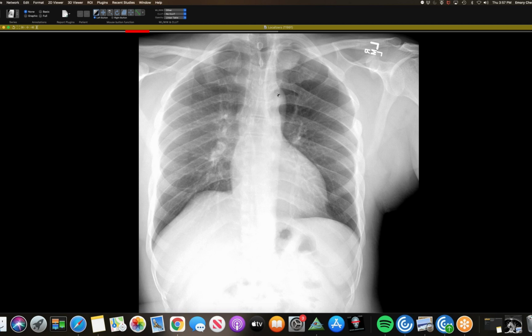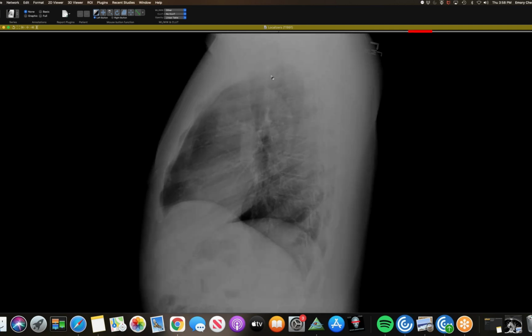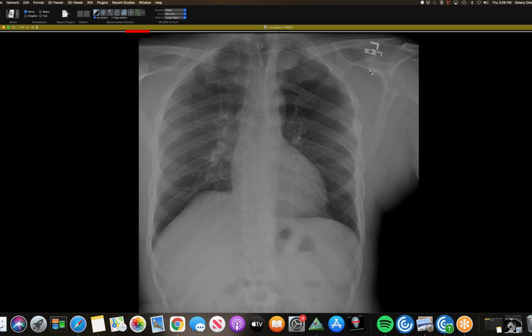I was wondering if you could see the wide neuroforamen on the lateral. I'm guessing it's obscured. I don't remember. Maybe you can make out something here, but I thought it was just a really subtle thing right over the clavicle here. But this person doesn't have other manifestations of neurofibromatosis. This is just an isolated neural tumor. It was just a schwannoma. They biopsied that schwannoma. Came back schwannoma, as you would expect.